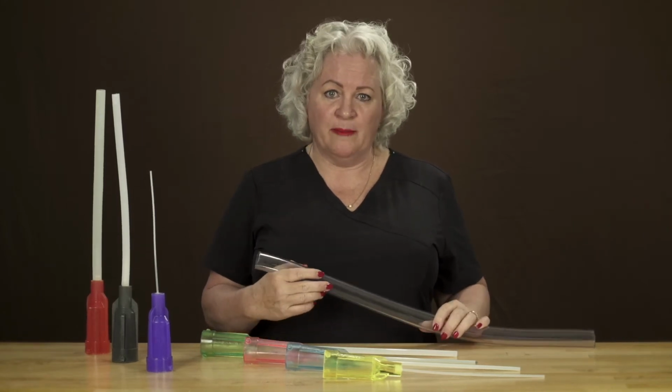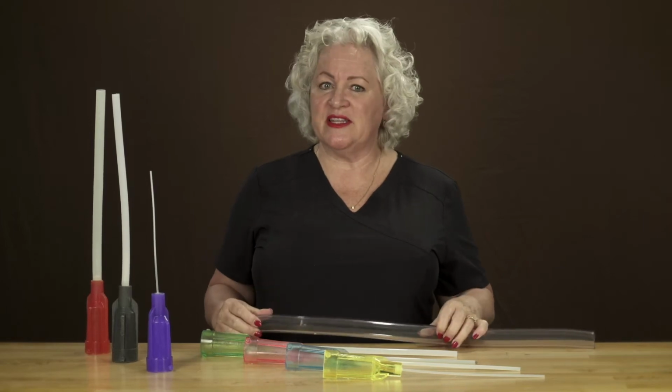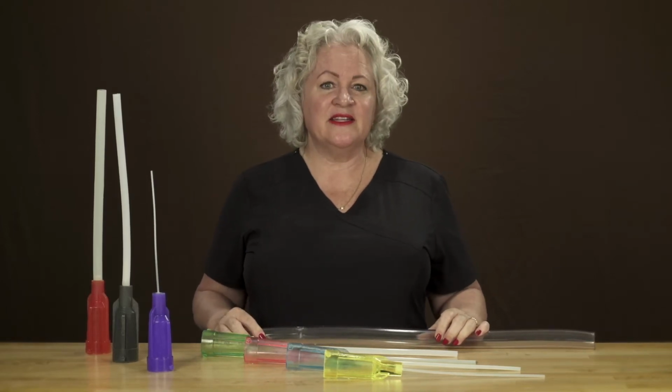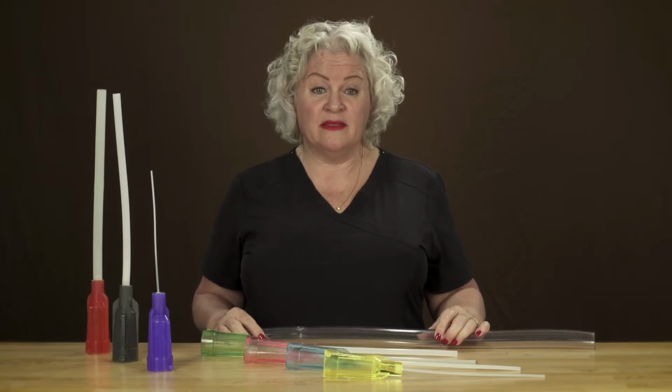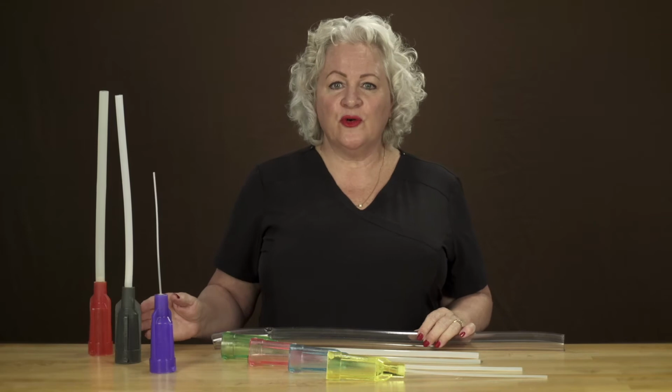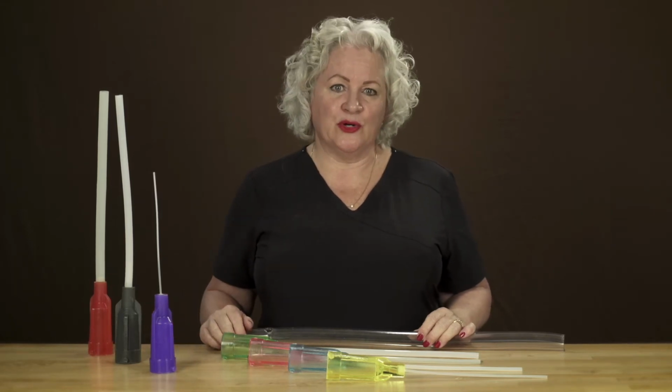The kit contains a simulated vein with the hole at the top to insert the cannula and a smaller hole on the back wall to demonstrate transfixing the vein, with the stylet that is included in the kit. One cannula per kit will accommodate the stylet. Four of the most common cannula sizes can be found in the kit, though a larger gray 16, an orange 14, and a small 26 gauge cannula can be ordered.